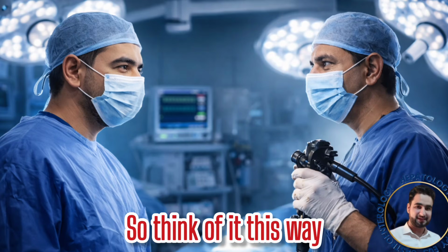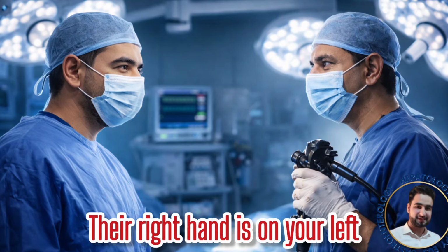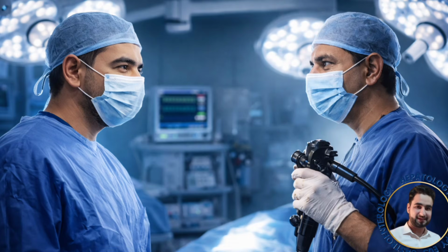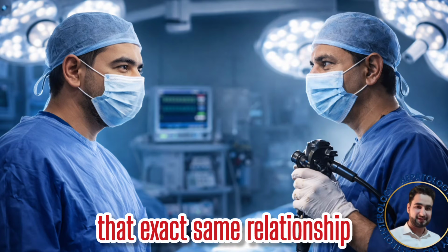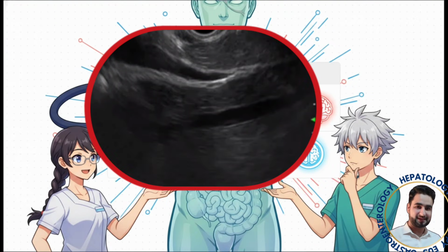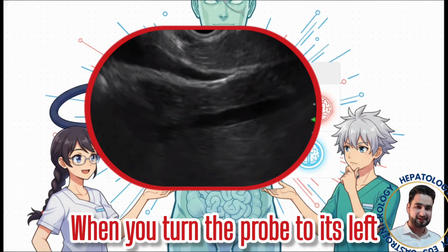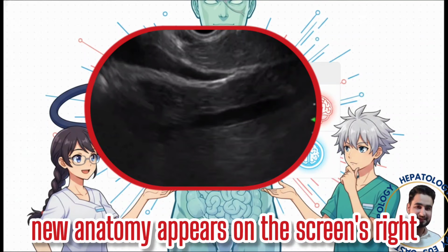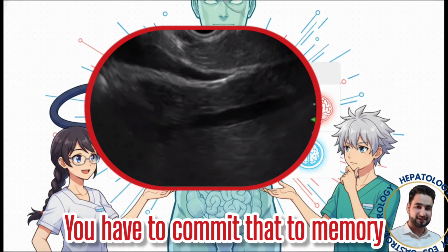So think of it this way. Imagine you're standing face to face with someone. Their right hand is on your left, right? It's a mirror image. Your EUS probe and screen have that exact same relationship. Let's just state it plainly so it sinks in. When you turn the probe to its right, the new anatomy will show up on the screen's left. When you turn the probe to its left, new anatomy appears on the screen's right. It's an inverse, mirrored relationship. You have to commit that to memory.